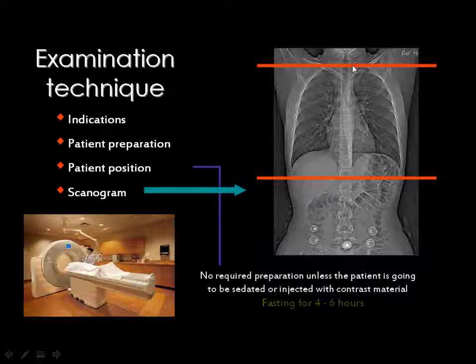And we put a line at the start of the desired area, and we also demarcate the end of the scan. And whenever you put two lines like this, the CT machine will ask you about the interval of scanning. Would you like to scan this area every 1 centimeter, half centimeter, 3 millimeter, or what else?